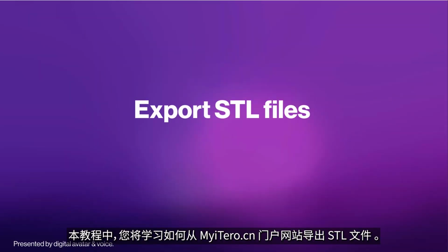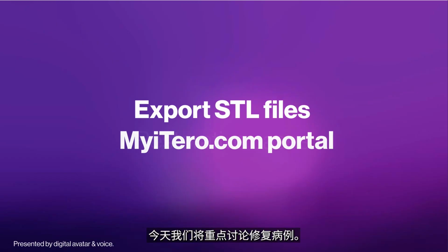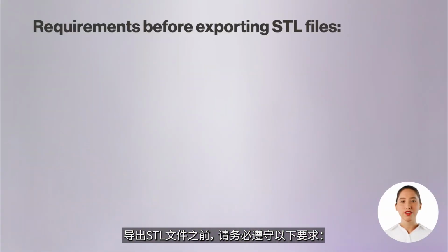In this tutorial, you will learn how to export STL files from your myiTero.com portal. Today we'll focus on restorative cases. Before exporting STL files, make sure you follow these requirements.